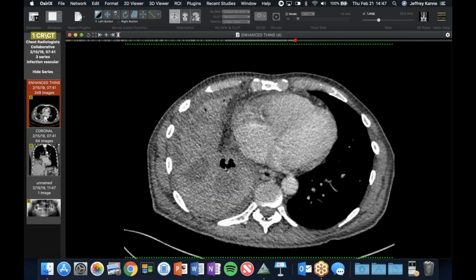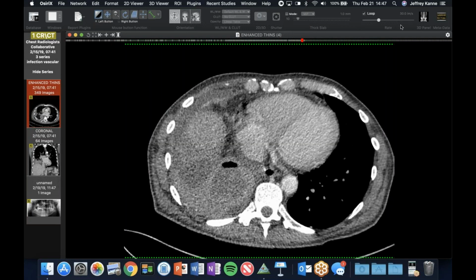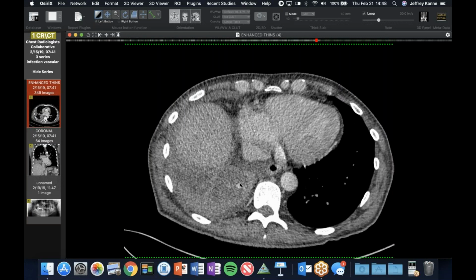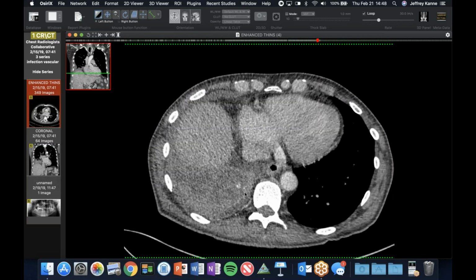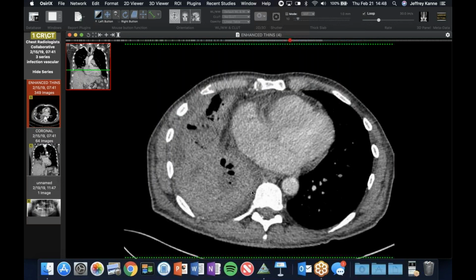And there's this abscess cavity down the right lower lobe. As a matter of fact, I think there's two abscesses because I could see that there was a little band of tissue in between. This one has gas, but what I noticed was this little flash of contrast. And if you scroll quickly, gently through it, you can see that it sort of branches right there and there. And this was not appreciated on the outside.